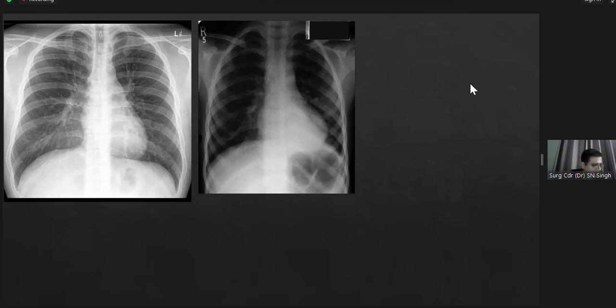Just say again, fast. So this is a triangular retrocardiac opacity seen with the apex pointing towards the hilum. Left hemidiaphragm is obscured. And after that, there is no calcification. Very good. No air bronchograms. It's a homogeneous opacity. Very good. There is no fluid or lucency within the patch. No air fluid level. Very good. So these are the things. Anything else which you think is striking?